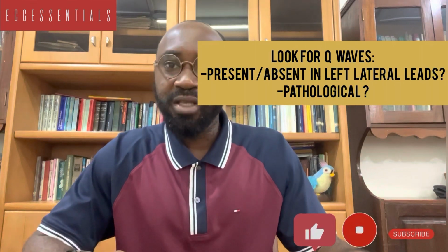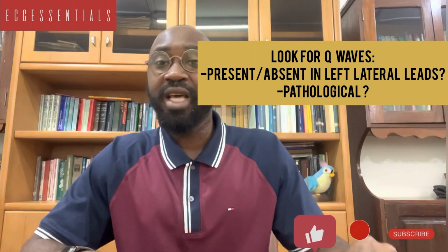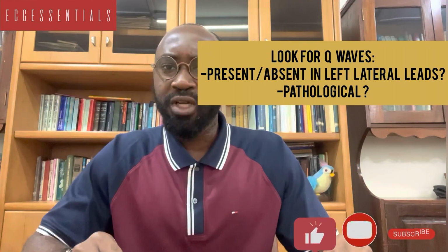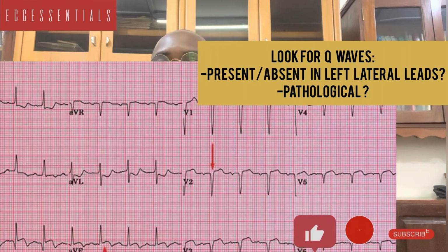So it is important to pay attention to that small negative deflection, that is the first deflection of the QRS complex. And it's also important to look at that because there may be pathological Q waves.